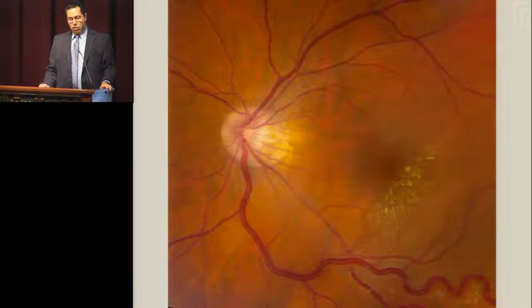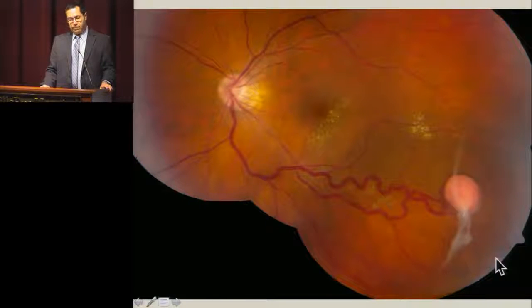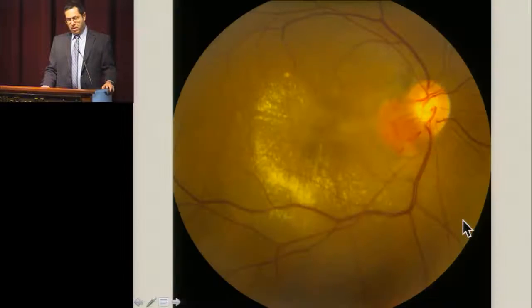So this is the same patient. You can see here the macular exudation, with a relatively clear area between the macula and the tumor itself. The feeder vessel, there is actually some fibrosis, as you see on the surface of the tumor. That was the peripheral type.